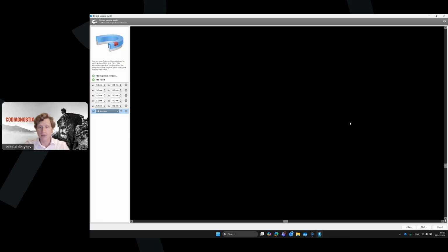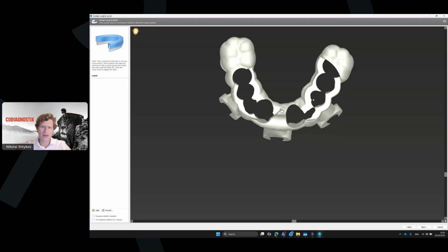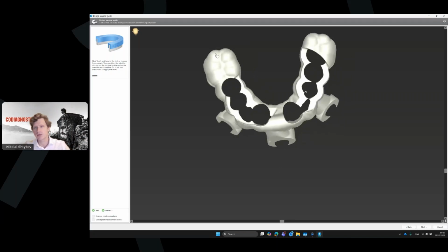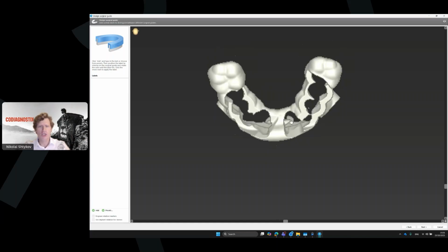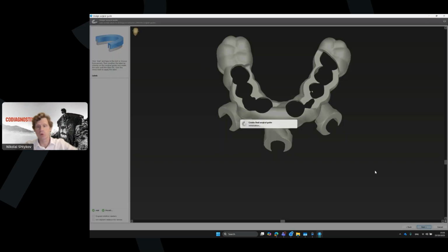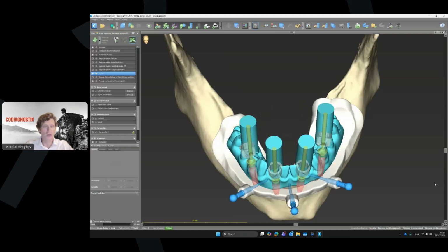And that's it. And this is the cage. And of course, if you're not happy with this design, for example, I think it's not bad, it's workable, but you can improve it. You can maybe make an inspection window here. Actually, in this kind of design, yeah, we could have some place to hold the prosthetics, and we still have the holes for where to put the screw and to put the glue when you connect your copings with it.